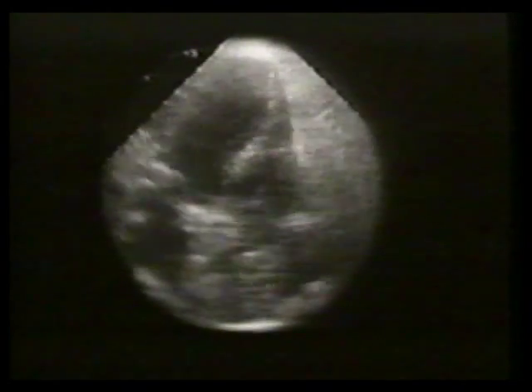This is the typical location for hematomas after valve replacement or coronary bypass surgery, and therefore this region should always be carefully inspected with this type of clinical presentation. If this lesion cannot be confidently excluded with surface echocardiography, including imaging from the right parasternal window, then a transesophageal study should be employed.